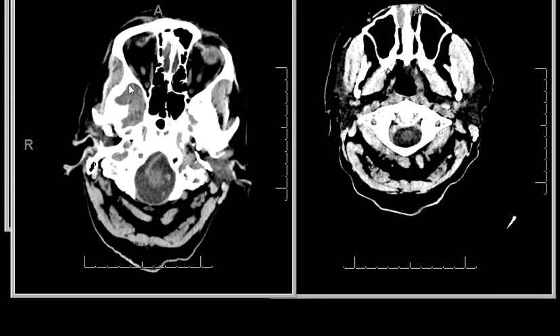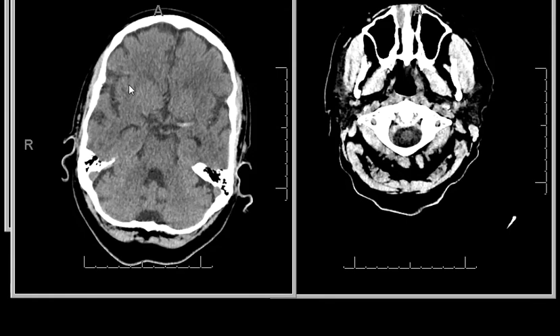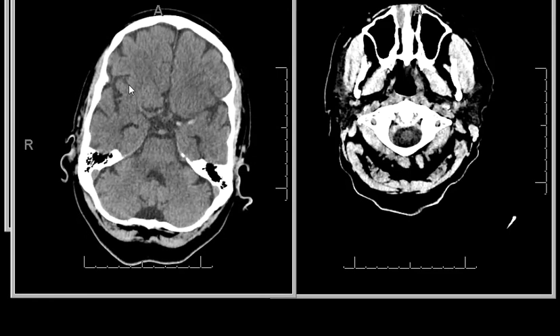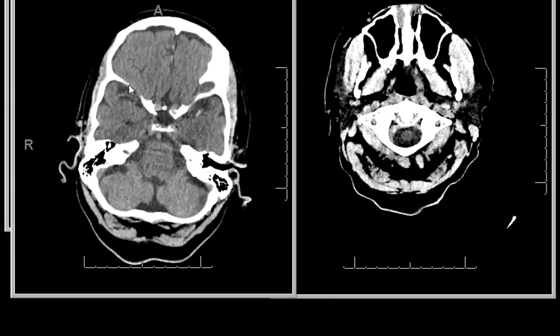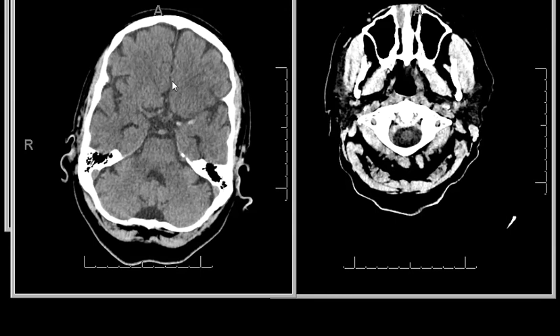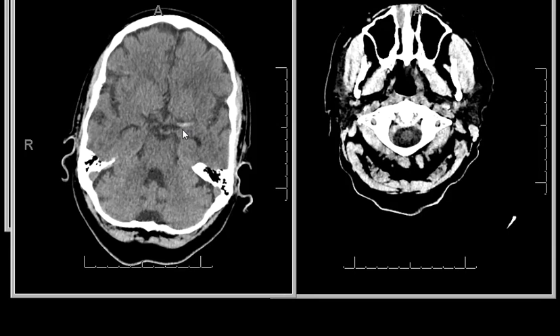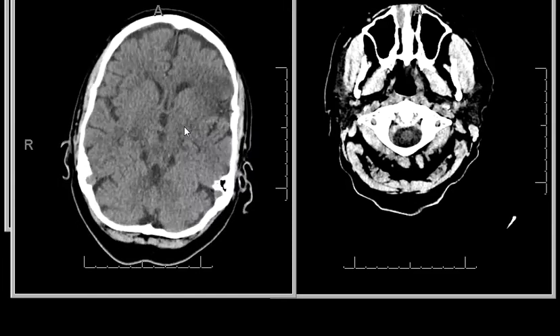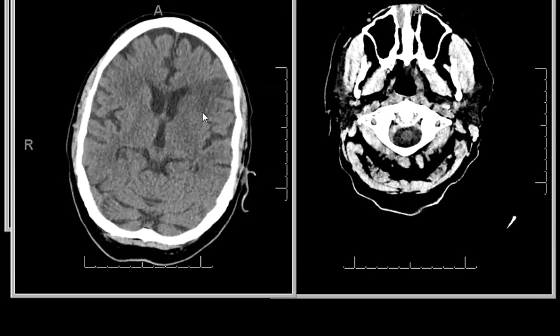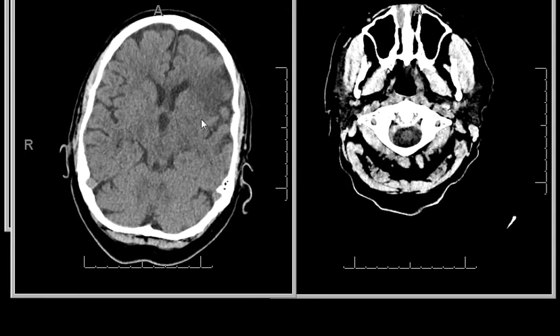Because our radiologists went through the CT perfusion training, everybody now has heightened awareness of the importance of reporting blood clots and treating patients with wake-up stroke. This patient at 8 o'clock in the morning presented with a CT study of the head with symptoms that correspond to this hyperdense blood clot in the left middle cerebral artery, and showed some signs of ischemia already: hypodensity, loss of gray-white matter distinction.